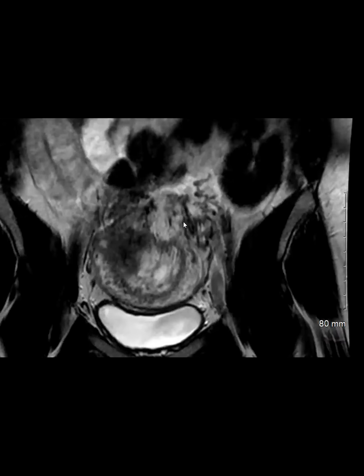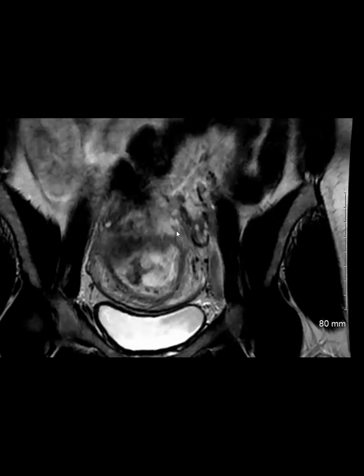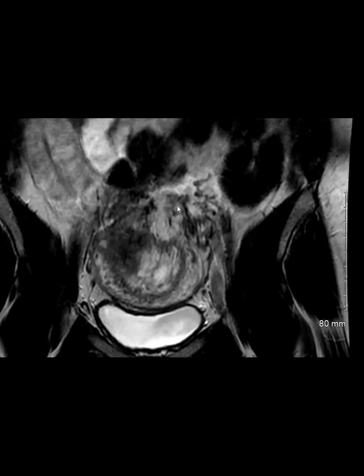So, just a few salient features of an interstitial ectopic gestation on an MRI. One of the things to look for, again, the interstitium is the portion of the fallopian tube within the myometrium where the fallopian tube attaches to the uterus, right? And so one of the features by which you can recognize that this is an interstitial gestation is apparent contiguity with the myometrium, because the implantation is within that intramural portion. And so if you see this kind of contiguity, this appearance favors an interstitial gestation rather than something called an angular pregnancy.